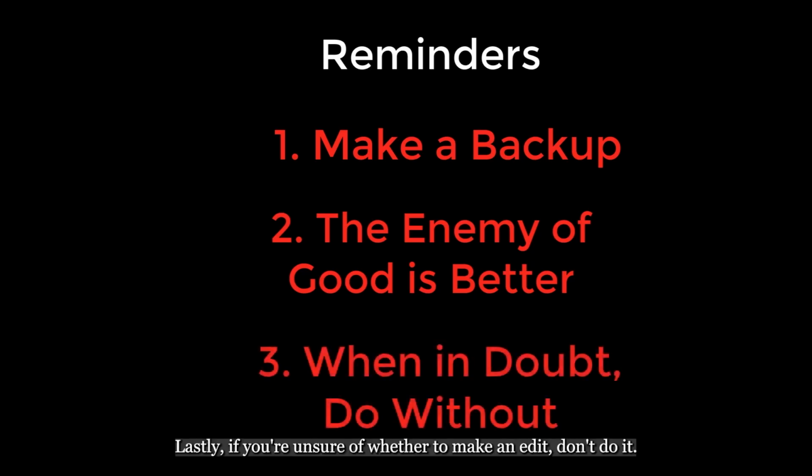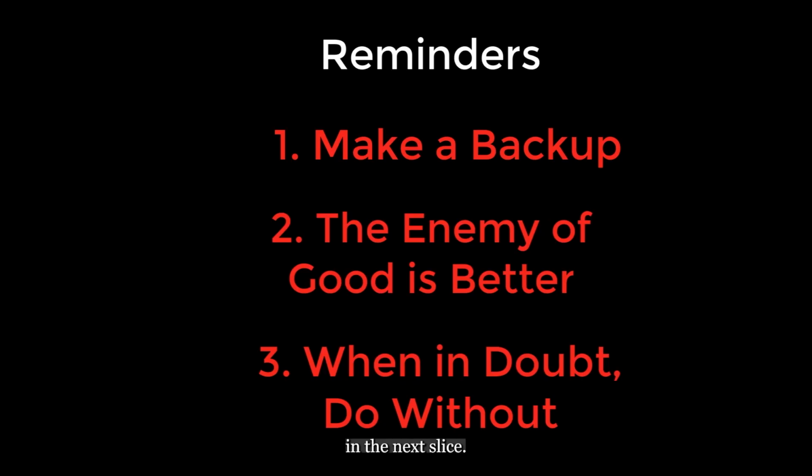Lastly, if you're unsure of whether to make an edit, don't do it. Remember that we're editing 3-dimensional volumes, and what looks like a problem in one slice may resolve in the next slice.